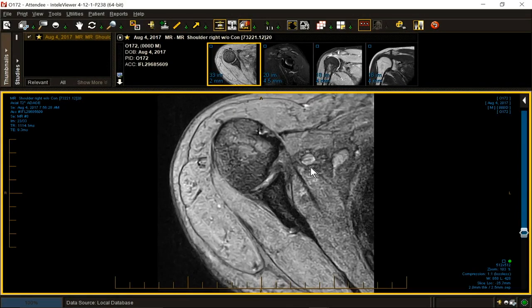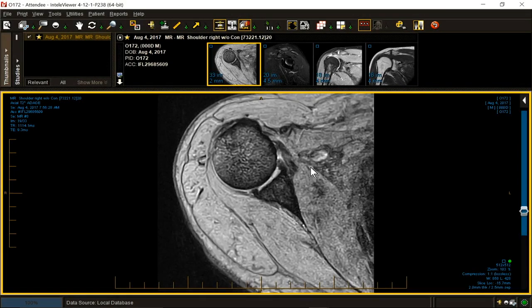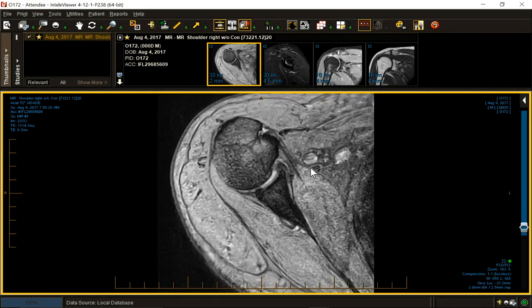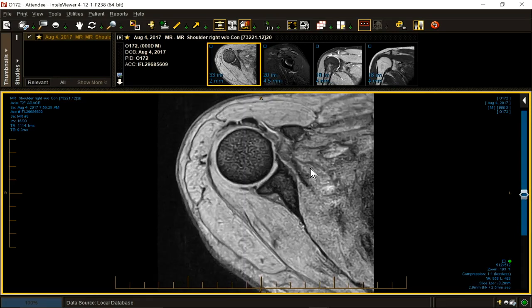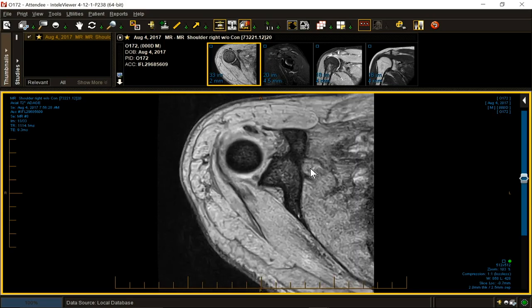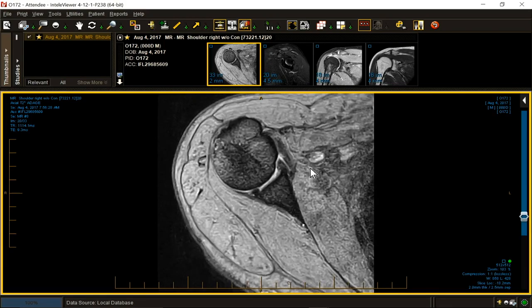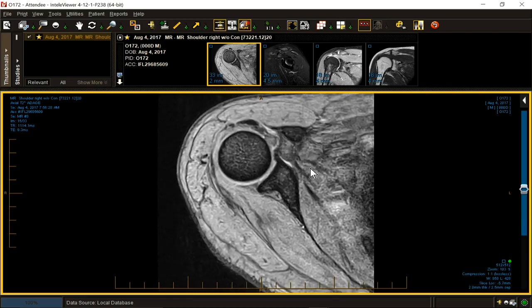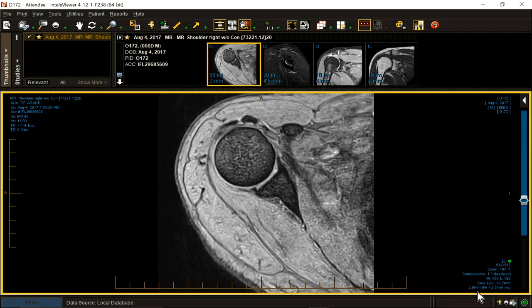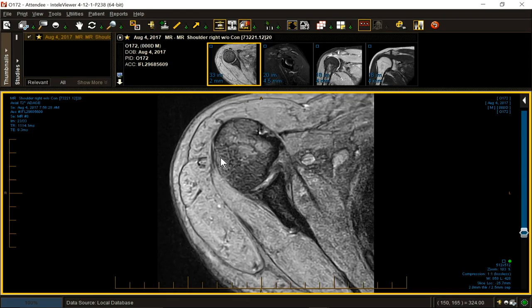So I am given an axial gradient echo: high signal to noise, contrast resolution moderate, articular sensitive, calcium sensitive, blood sensitive, siderotic sensitive. Water, moderately sensitive. Through plane resolution, good, 2 millimeters. In plane resolution, good, field of view reasonable. Fat suppression, not so much.